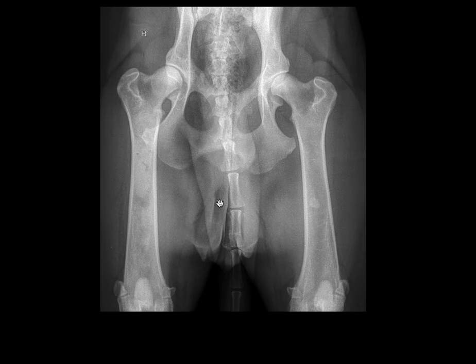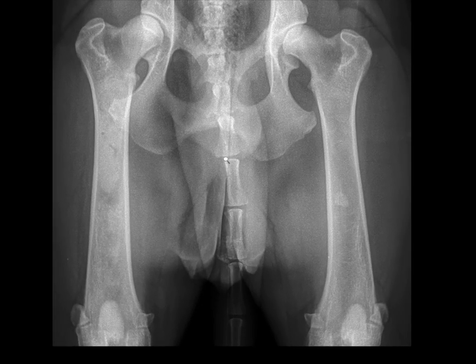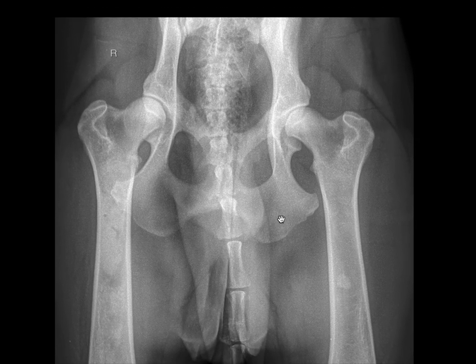Before I conclude about these findings, I'll make a few brief comments about the pelvis. There is some obliquity of positioning in the pelvis, which does somewhat limit our interpretation of hips. Of course, the young patient age can also limit the use of this view. We know that this view is more reliable for assessing hip status in patients that are 2 years of age.